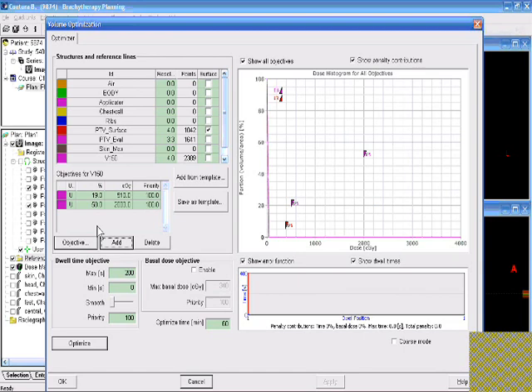We'll add one more, which is an upper by default. And this will be 6.5%. And the dose will be 680, which is 200% of our prescription, because they probably won't be used much for the optimization itself.